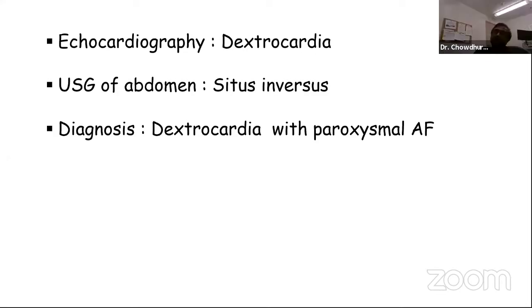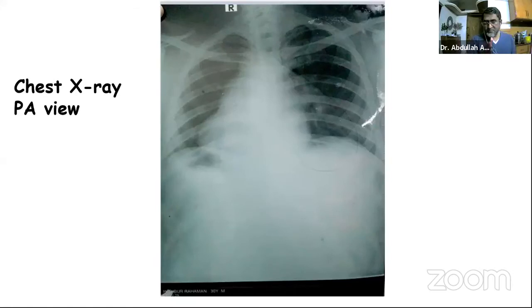One thing I request: if you say that this is not dextrocardia but lead transposition, and if you don't diagnose that, don't read the ST-T changes if the leads are changed, because then you may be in trouble. So get these right, then read it. Exactly, that's the point. And actually, this fits more with mesocardia, where the apex faces towards the sternum.